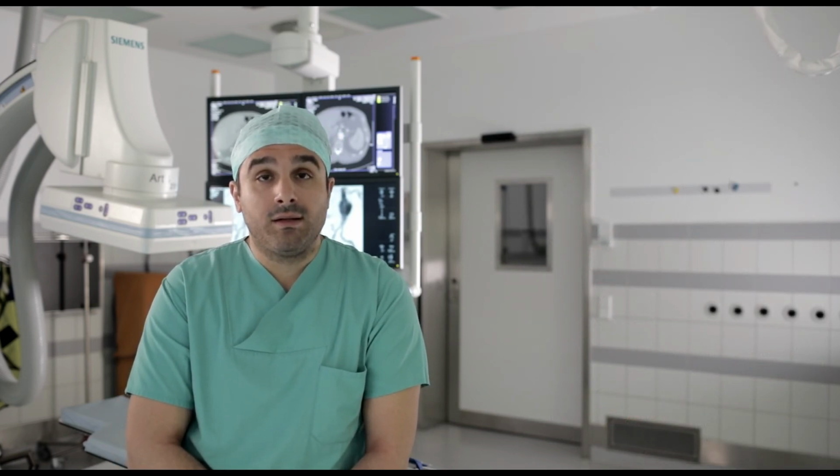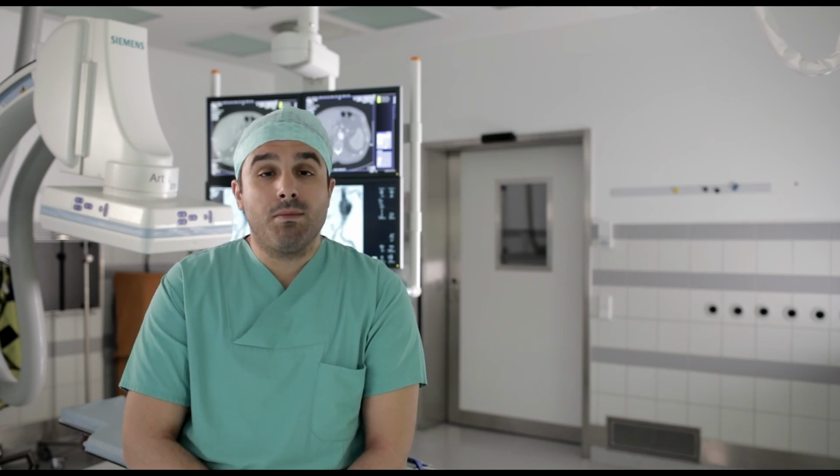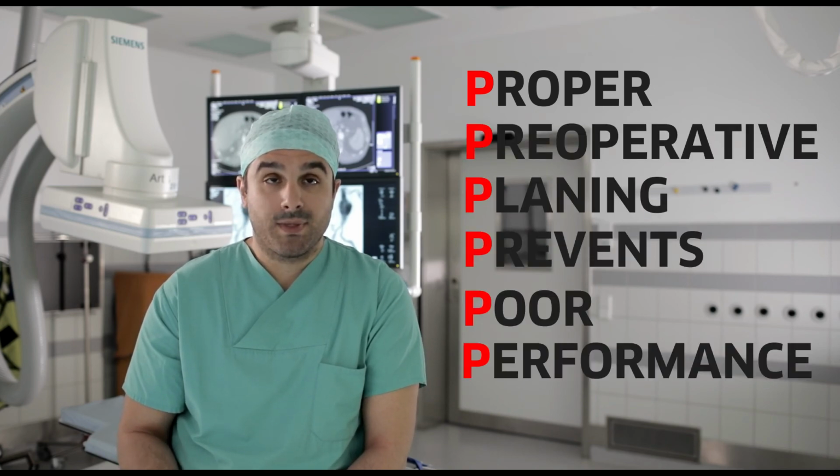Before closing this first chapter of our tutorial about the principles of planning on EVAR, I would like to remind you the 6 P's of success. And these are: proper preoperative planning prevents poor performance.